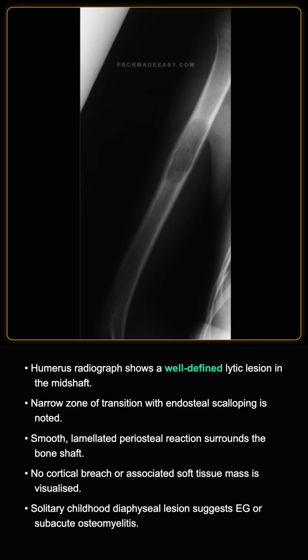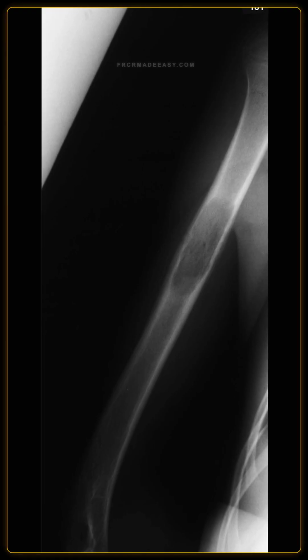soft tissue mass. These non-aggressive findings of a solitary lytic diaphyseal lesion in a child are highly suggestive of an eosinophilic granuloma or subacute osteomyelitis. What is the differential diagnosis for a solitary lytic bone lesion in a child? And how can we differentiate eosinophilic granuloma from infection?